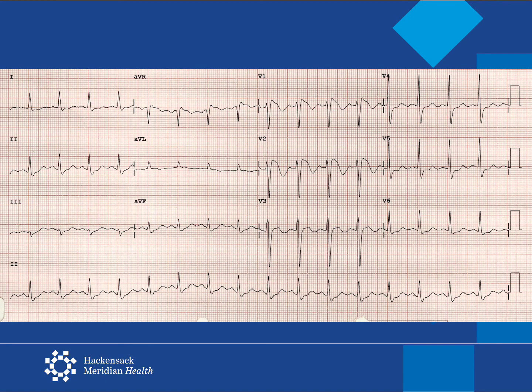This patient presents with syncope, and it looks like he has a right bundle branch block. We've said before right bundle branch block could be normal. But is it? This is an unusual form of a right bundle branch block, and one that you don't want to miss.